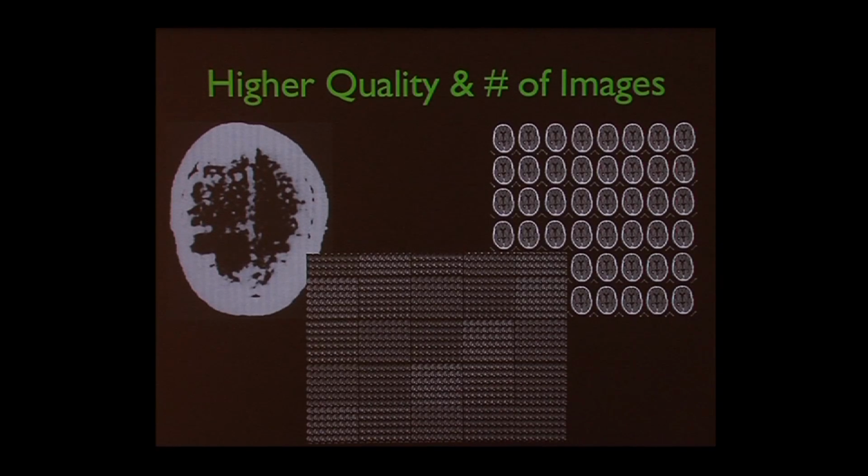It becomes very cumbersome to go through all the images one by one, which is what we do, but also to get a three-dimensional appreciation for the anatomic relationships can be difficult for some people. Some people think really well in 3D, and they build the image in their mind and they can figure out the relationships. Some people don't, and people are just born that way.